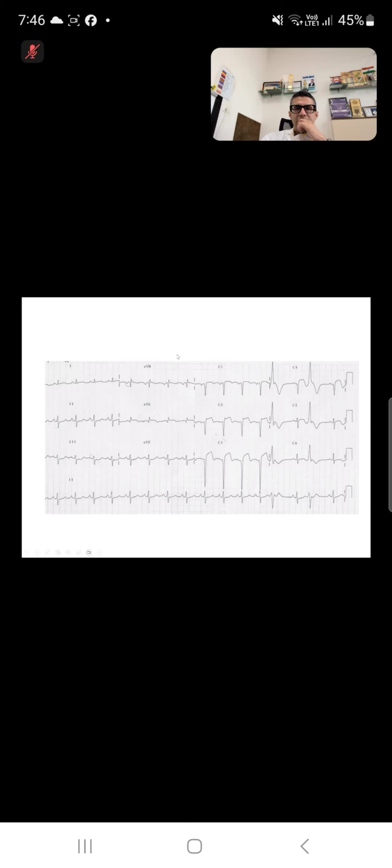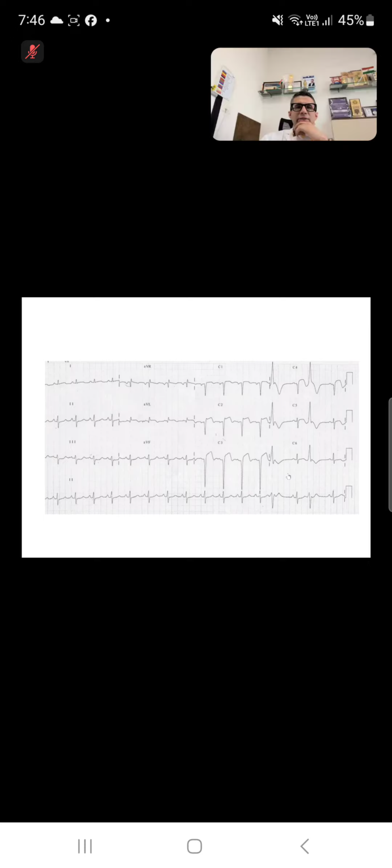So is it important or not important? These are important. Why? Ectopics are emerging from the ventricles. The patient has ectopics and suddenly this patient can throw a VT, VF or something. So identification of VPCs is again important. Also look at any electrolyte abnormalities in this particular patient. Now, what is your full diagnosis in this patient?